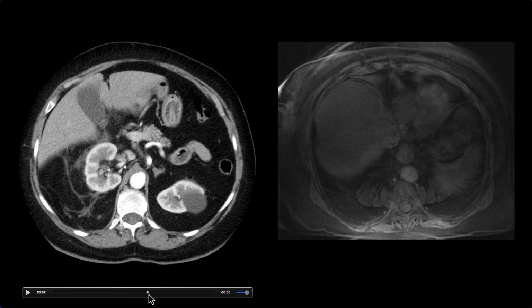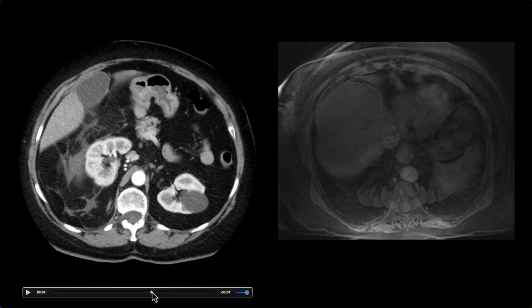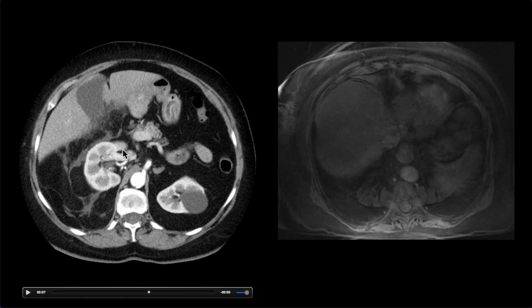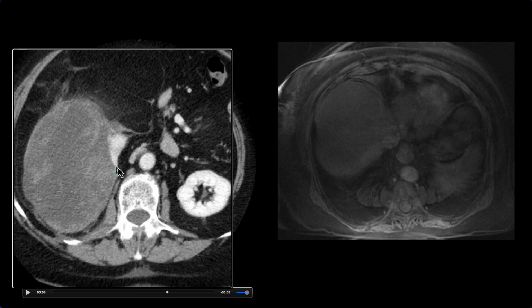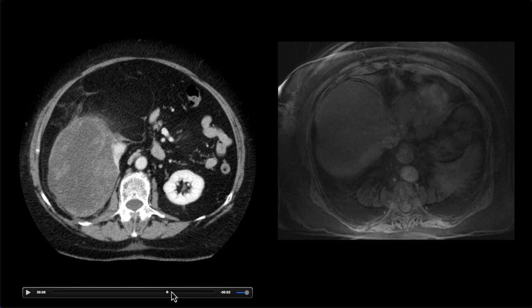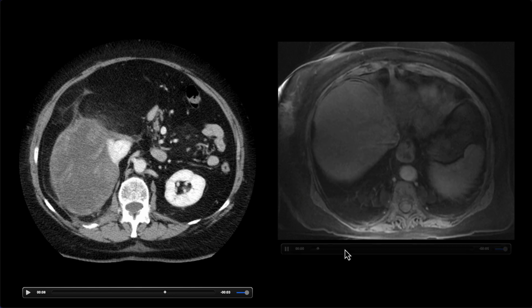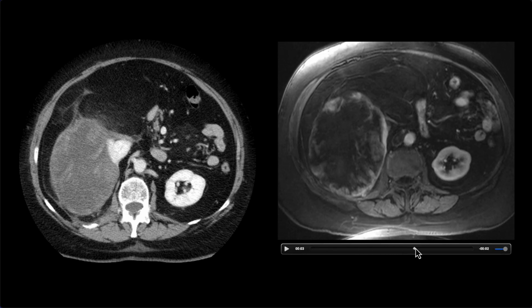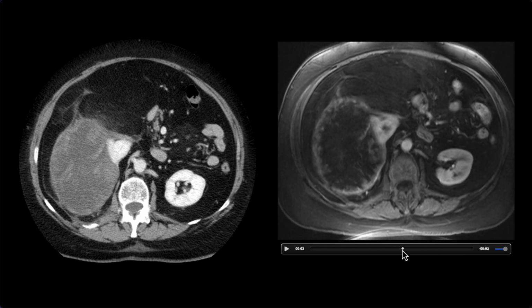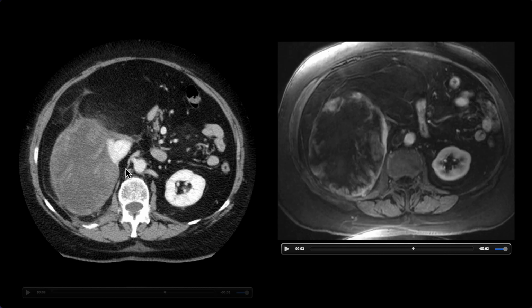And continuing on with another example of a retroperitoneal tumor. Here we have displacement of the right kidney anteriorly, and then that wrapping of the renal cortex around portions of the mass, indicating that it's actually arising from the kidney rather than just displacing it. And here we did an MRI, which basically shows, as you might have guessed, the MRI version of the CT findings, but still interesting images to look at.